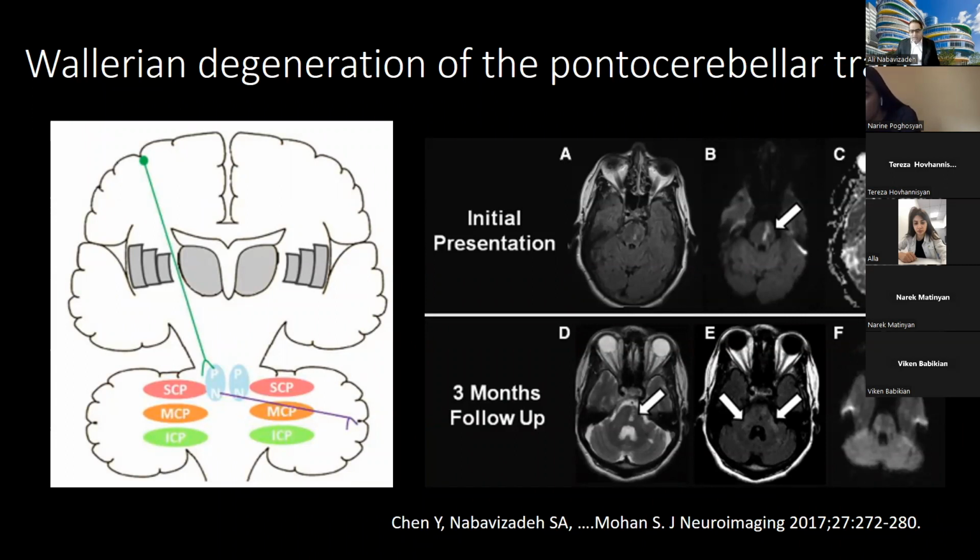Again, it's very important not to misdiagnose them as some new infarct or demyelination or some metabolic disease, because they are symmetric, and the knowledge comes from neuroanatomy and knowing that these are the tracts that will be involved in Wallerian degeneration due to the infarct.